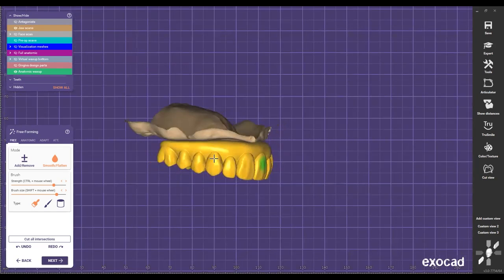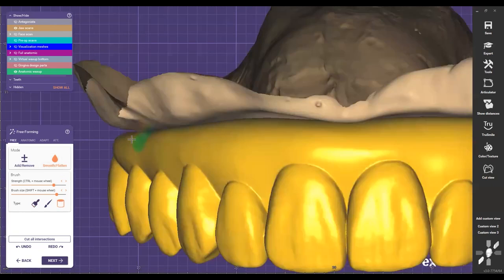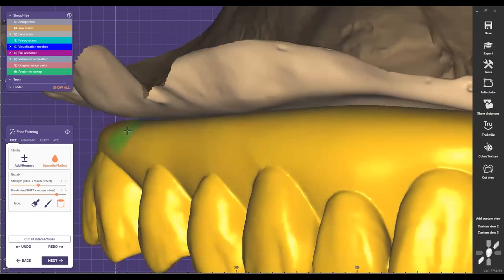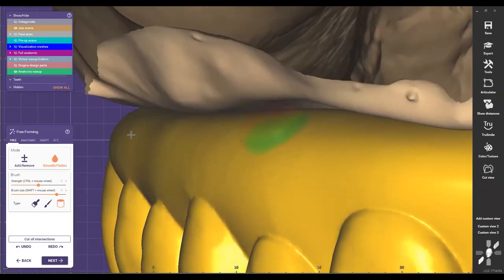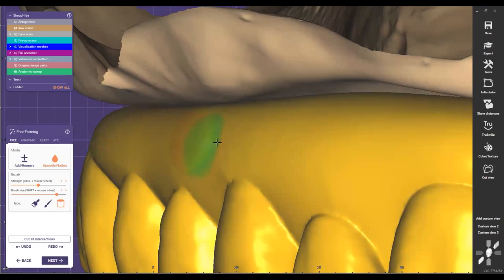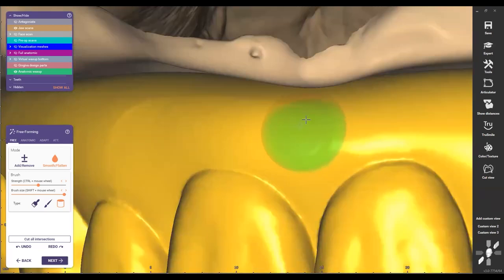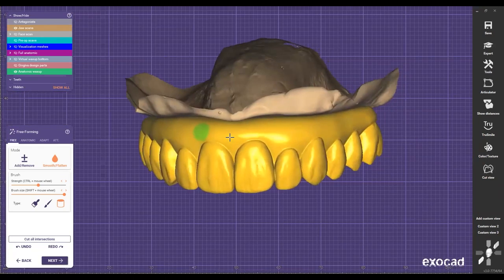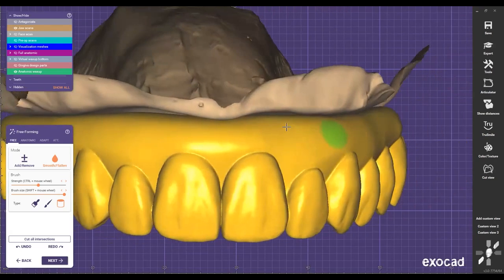So I make it ideal like this, and then from here I can start making little changes. If I know that my tissue is going to have bone reduction there, I need to make this more in, like a nice angle here, right? Make it go more inside, so it's going to save you time when you bring the surgical tissue right here. So now I'm going to start pushing that tissue in, so it looks much better with the new tissue there. That's why I'm looking from different angles.